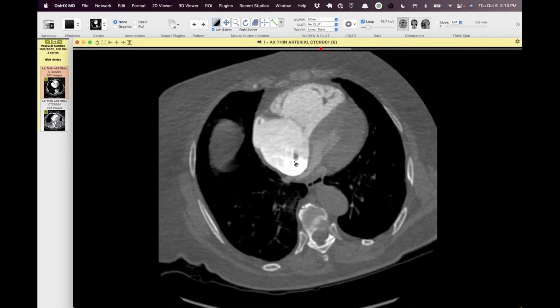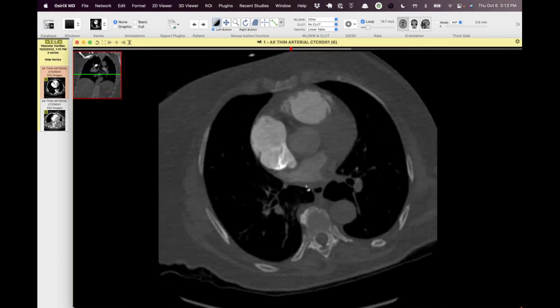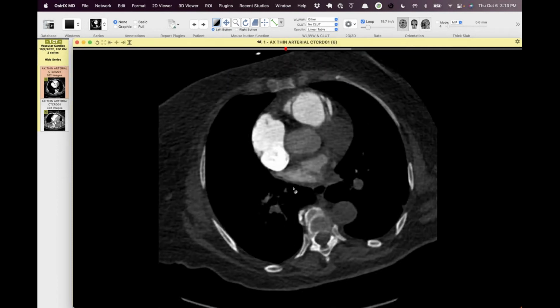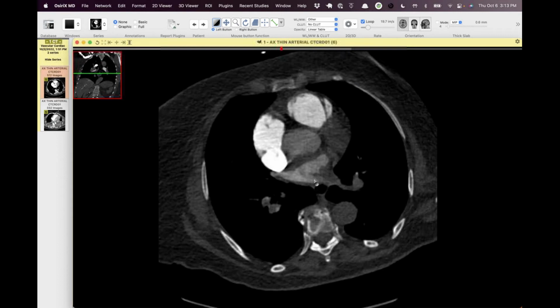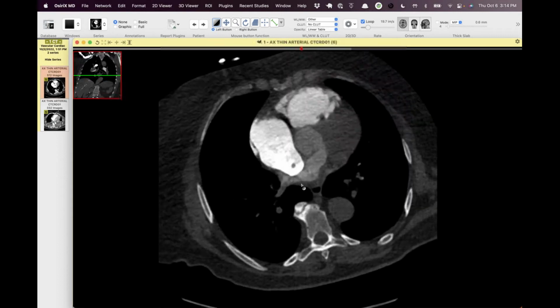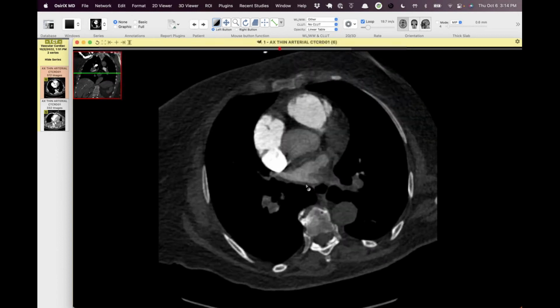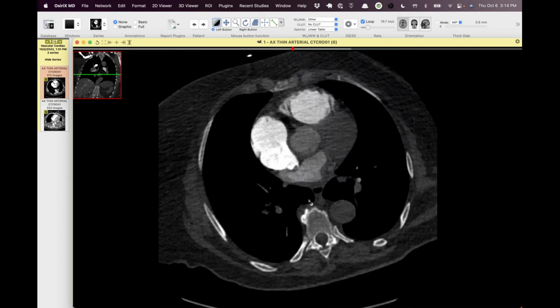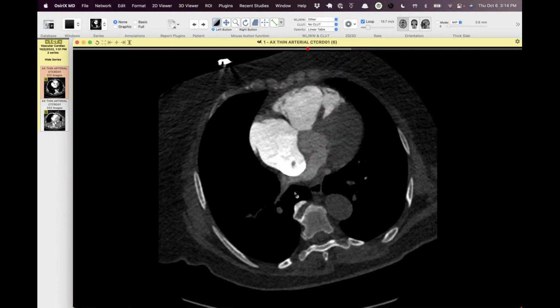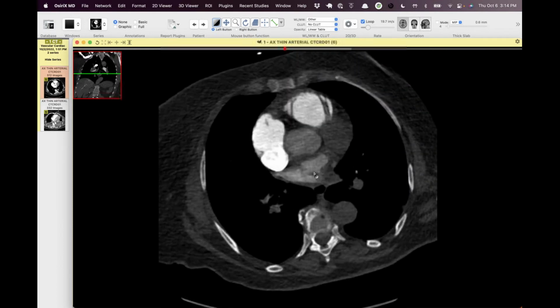And here we not only get the PFO, but you can see the clot in transit as it crosses the PFO and then goes towards, if I can window this better, towards the roof of the left atrium right here. So it's the typical direction of the PFO, to go from inferiorly in the right atrium to superiorly in the left atrium. There was one question of whether or not this was just flow artifact across the interatrial septum, but that wouldn't make much sense because it's going right to left where the densest contrast is. So this just looks like we happen to catch that clot.